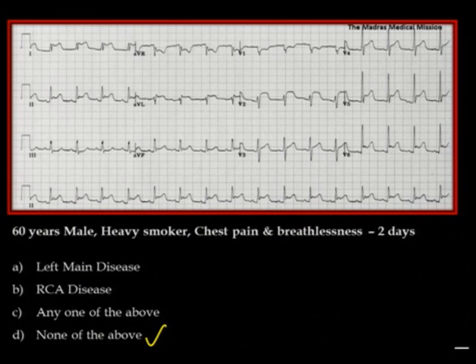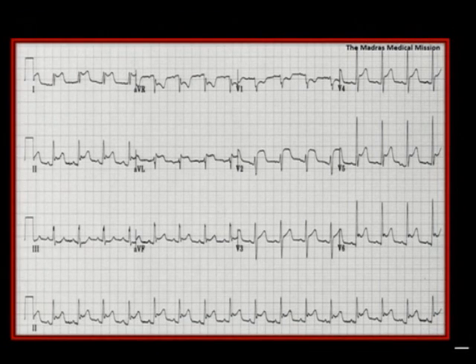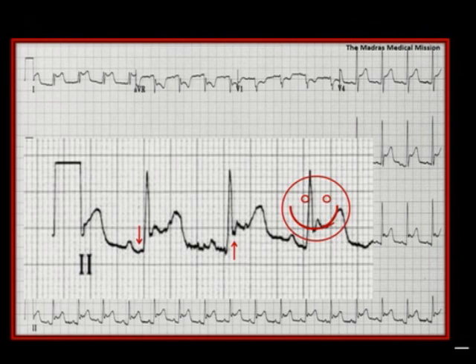Over a period of 3 days you will see dynamic changes in this. So ladies and gentlemen, there are ST segment elevations of this kind, and if you think you can put the smiley onto that kind of an ST segment, and if you notice some kind of early repolarization changes, you can be rest assured you are dealing with not really a serious case in the form of an acute coronary syndrome.